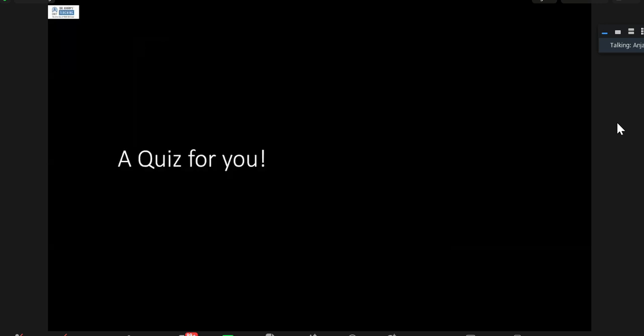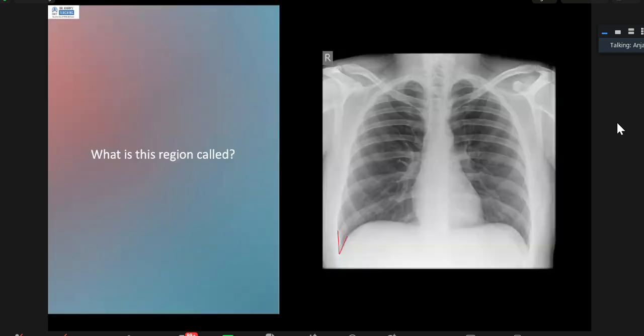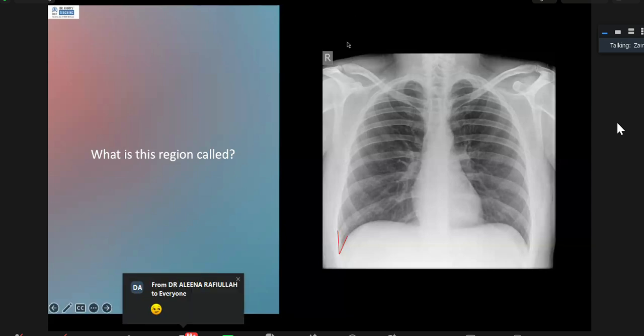Now we come to the last session. So there is a quiz for you, and over to you, Zain. Thank you very much, Dr. Sujith. So another couple of questions for everyone. Starting off with, what is this region called?